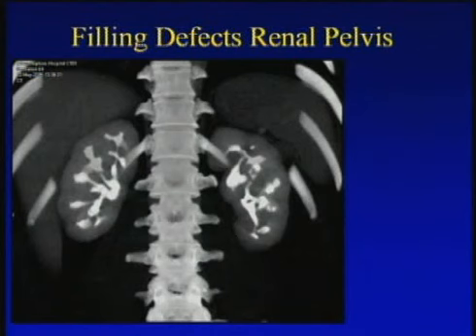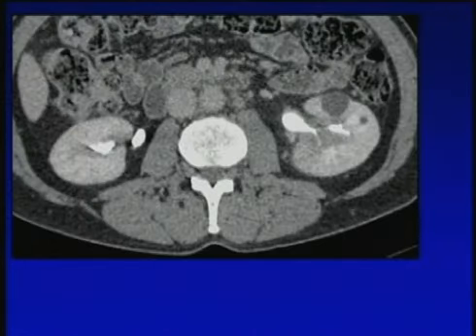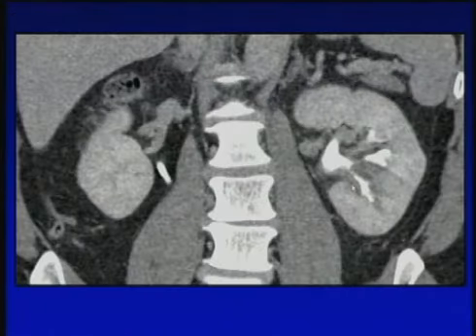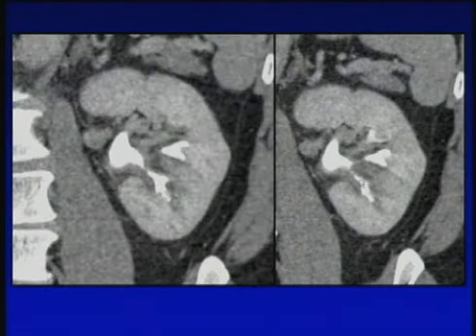And you can see in this case multiple small polyps within the pelvis and collecting system, very nicely defined. So you can see the visualization supplements the early imaging. The comment about looking at axial imaging alone is nicely shown in this example. Look at the left renal pelvis. I think you should be able to recognize that there is something infiltrating into the pelvis here, but I would say it's fairly subtle. You don't see the calyx showing here well, and we look at multiple images, but it's a little bit subtle. But if you take it into coronal, you see a little bit of soft tissue here, stretching of the infundibulum. Again, you see that here, so you're questioning what's going on here.